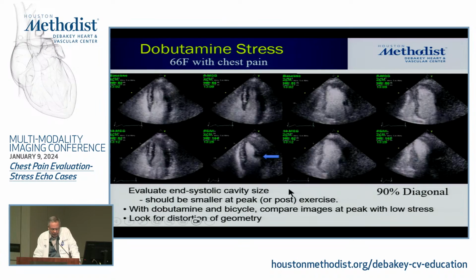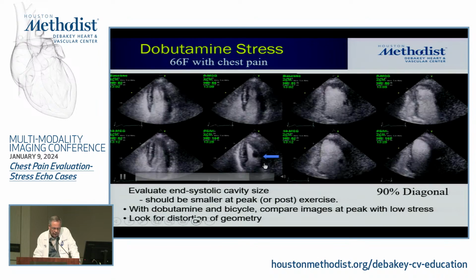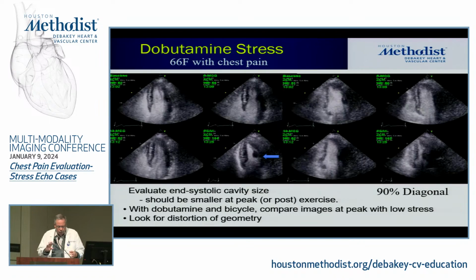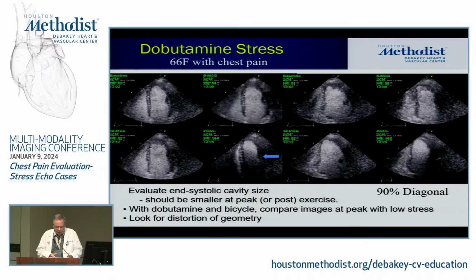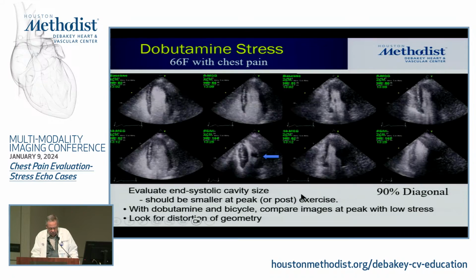Absolutely. Yes, that papillary muscle makes it look like the heart is doing great. Exactly, if you don't look at this area here. You're correct. And of course, those are some of the good and the bad of contrast, because clearly contrast has been very nice, but accentuates sometimes these papillary muscles, and you have to be careful with it.